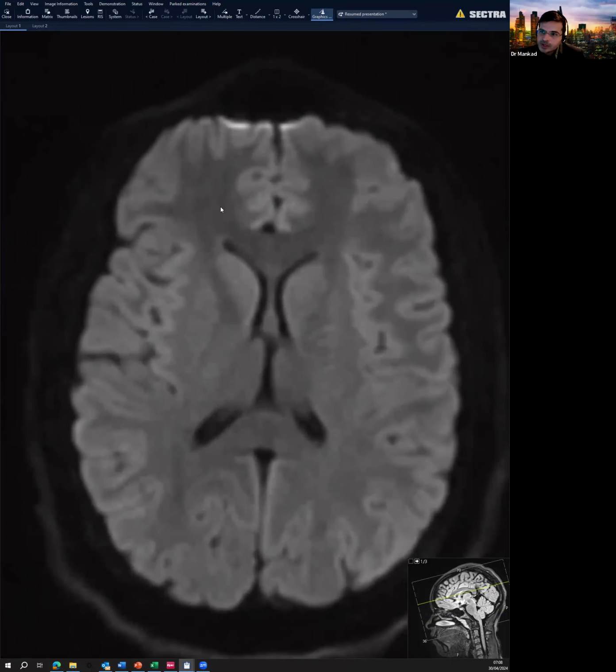Where you have the T2 dark, the CSF signal is saturated out. Essentially, it is a T2 weighted signal sequence, but it is highly sensitive to early interruptions to the Brownian motion of molecules and particles. And in this particular instance, this is referred to as diffusion weighted imaging.